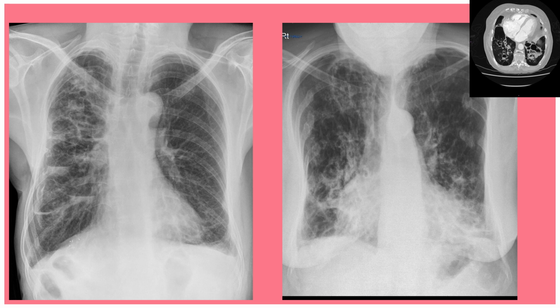And according to the CT, we notice that cysts are filled with fluid. And all these features are related to cystic bronchiectasis in severe state.